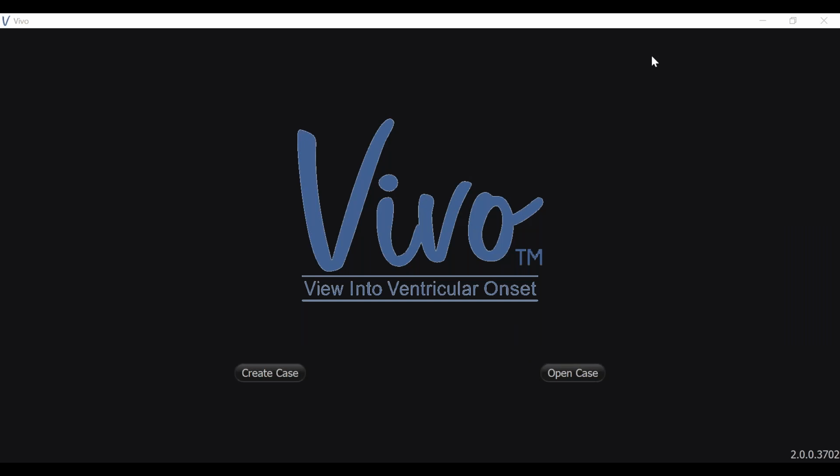Hello, and welcome to Getting Started with VIVO. We will be discussing how to create a case or open an existing case on the VIVO system.